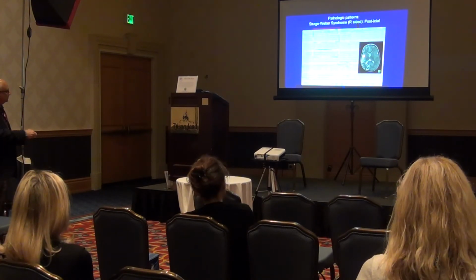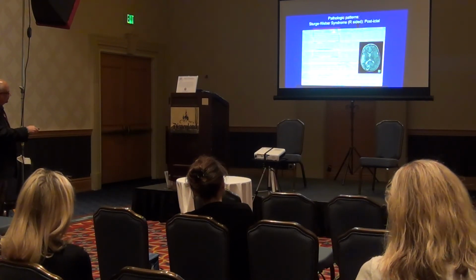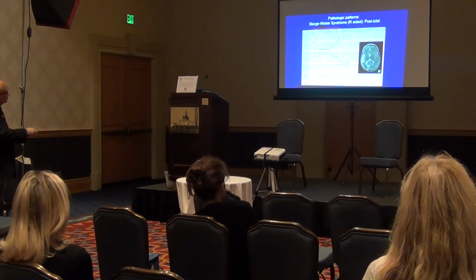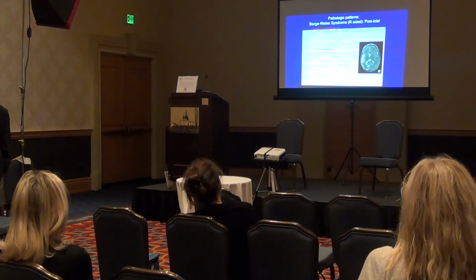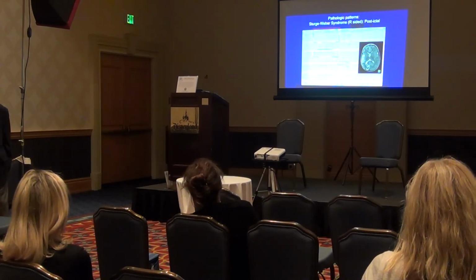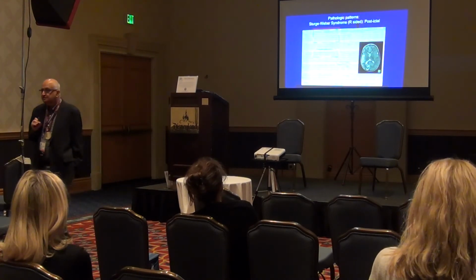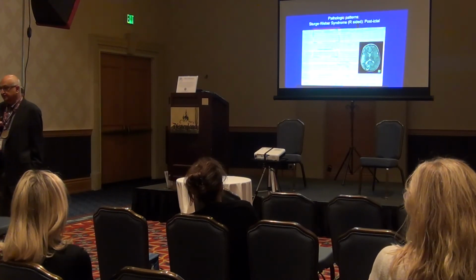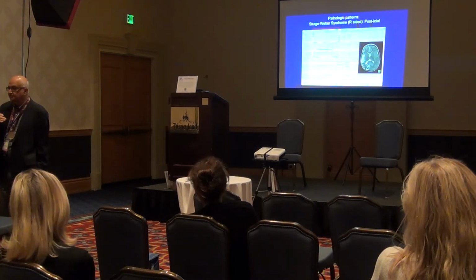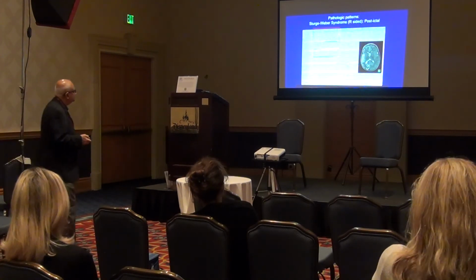So corresponding to that, those leads are slowing. When you go this way, that part is this, over here is that. So that's a nice correspondence, right, of what you see. When you see the EEG, you know something is wrong with that hemisphere. You don't know it's Sturge-Weber. This is why we need different modes of neurodiagnostics. Okay.